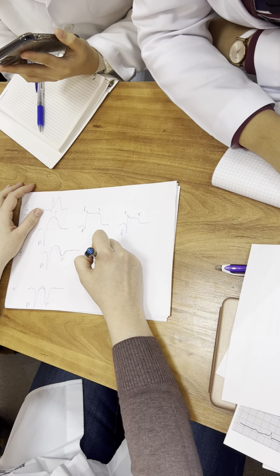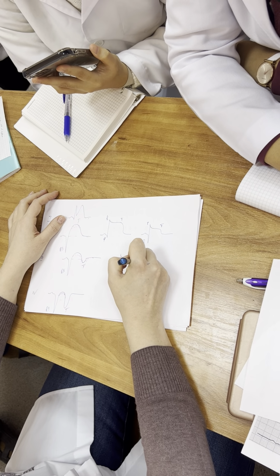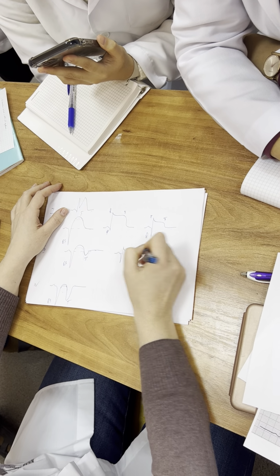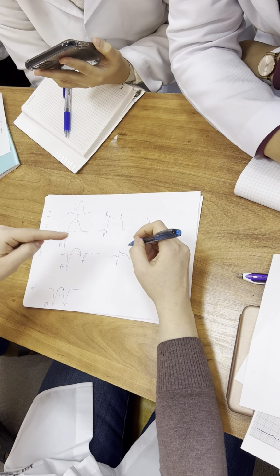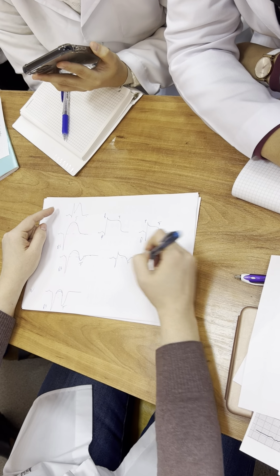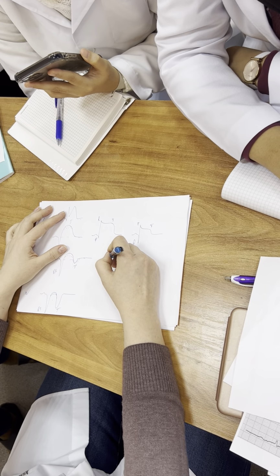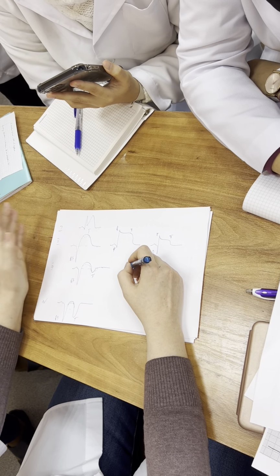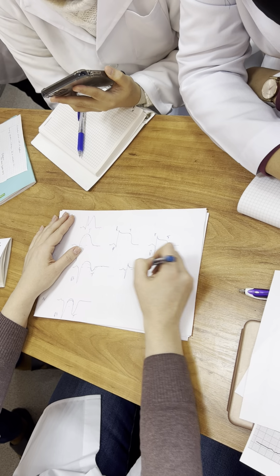Next moment, transformation to subacute stage. Understood? ST goes down to the line, T becomes negative. It's already subacute stage. Next moments during 20 days, ST tries to normalize, T becomes more deep.